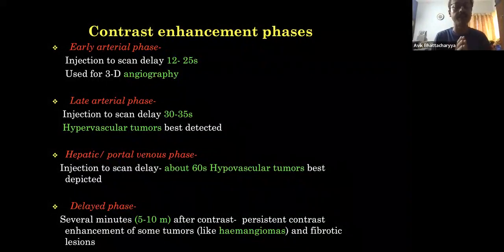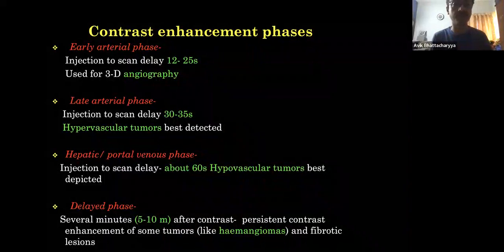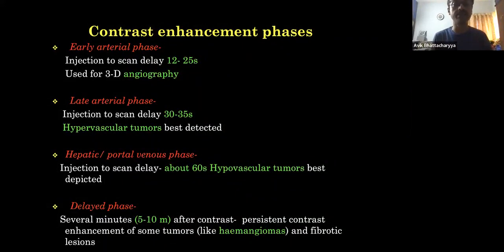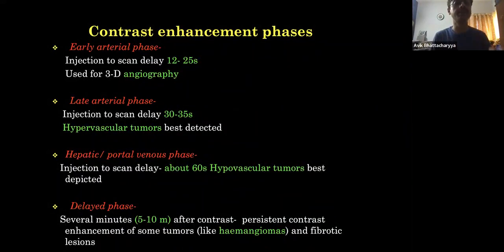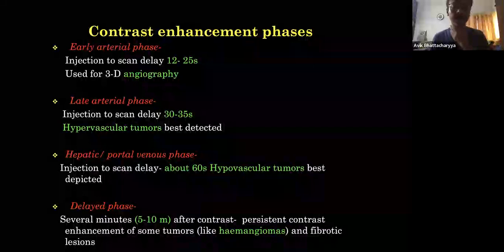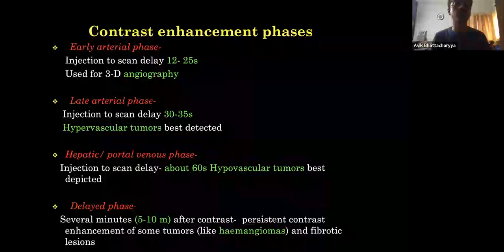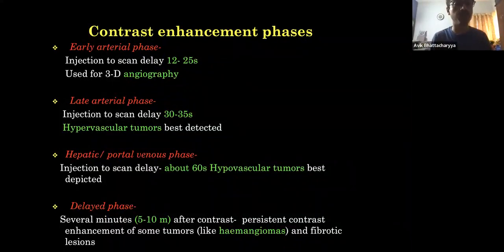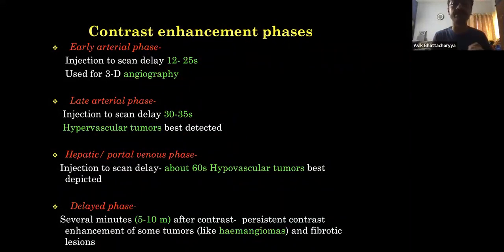See, if a pancreatic adenocarcinoma is big enough, you can see it on non-contrast CT scan also. If the pancreatic head mass is obstructing the bile ducts or pancreatic duct, you see both ducts are dilated. It is very obvious to delineate it. But if there is a small pancreatic tumor, which is otherwise not having any contour bulge, not seen on your non-contrast phase or portal venous phase or hepatic venous phase of contrast study, if we don't do a pancreatic protocol, we may miss that mass.